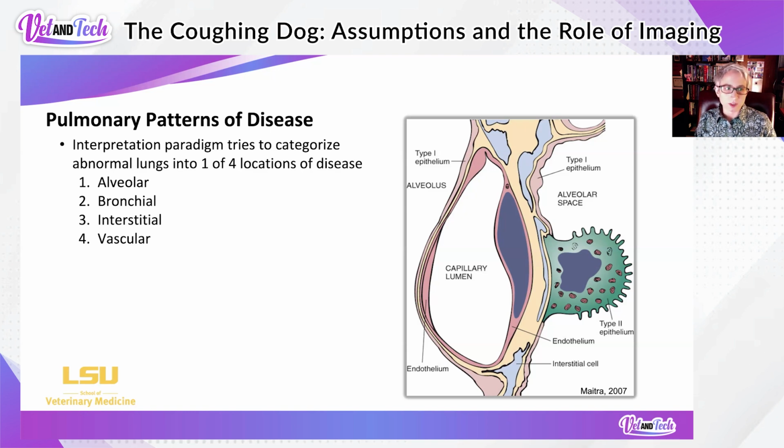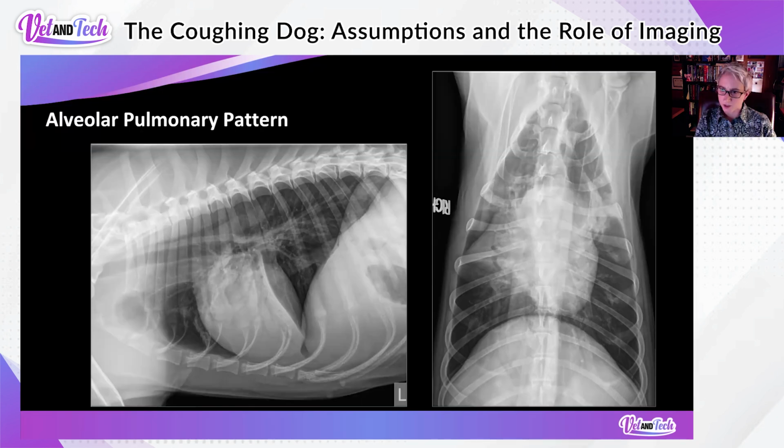But sometimes you do have clinical signs. Sometimes it's dyspnea, fever. Sometimes it's coughing. This is a dog that looks like he aspirated something. If you look at his lateral view, that's a left lateral, you can see these faint, branching, lucent structures. So to be lucent, they are gas-filled, they're branching and gas-filled, therefore these lucent branching structures must be bronchi. And when you see these lucent branching structures and you do not see a vessel on either side of it, they are effaced, that is then called an air bronchogram.